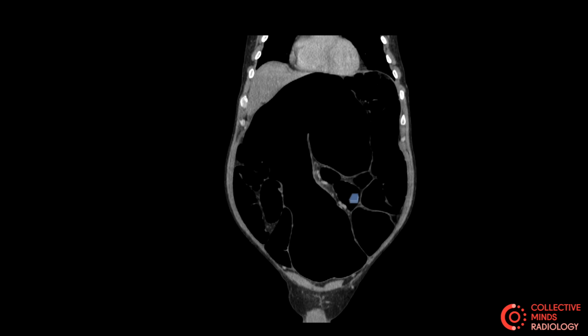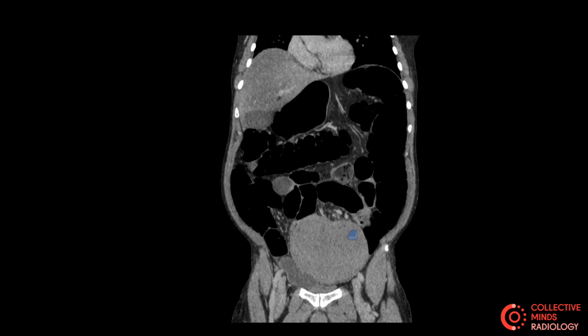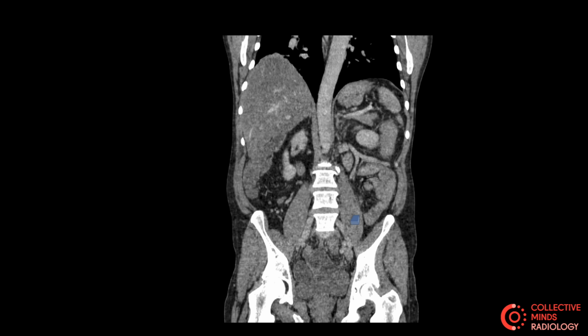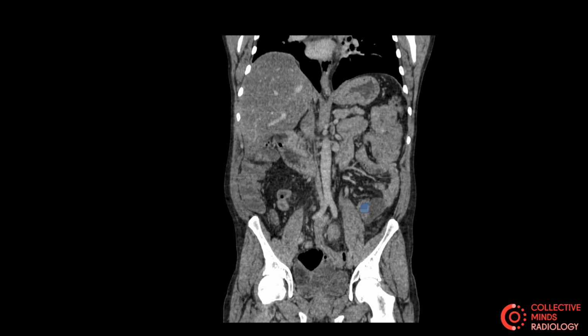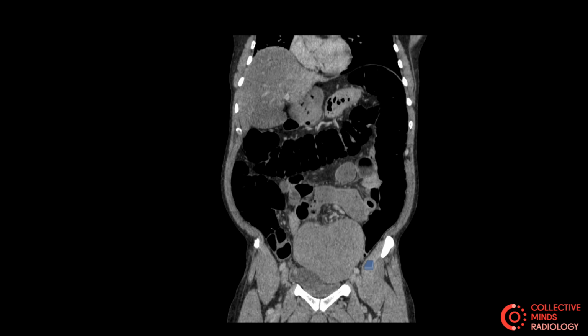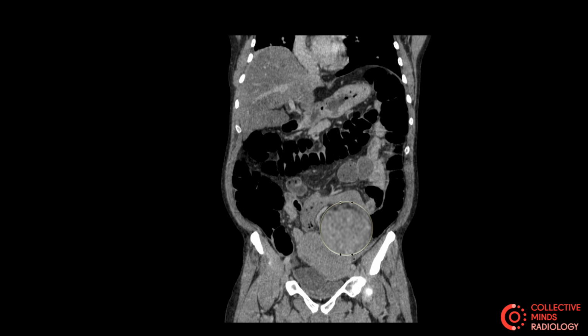Now the real giveaway is if you scroll through this abdomen, you'll see like a twisting of the bowel, and you'll see exactly what I mean. It'll be like a real whirlwind, a whirlpool. It's called a whirlpool sign. So if you haven't seen it, I want you to keep your eyes in this area here as I scroll through. I'm going to show you again. Keep your eyes there. Can you see this little dot? Now if I scroll through, it twists around and then becomes large. Twist around the other way, you can see all these vessels. See all these mesenteric vessels? They're all swirling around that particular area over here.